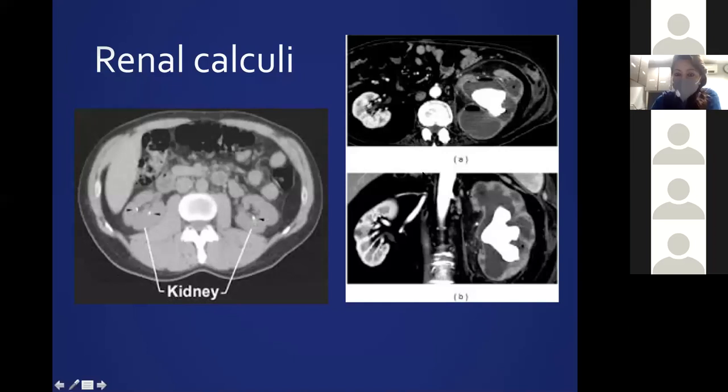This is another case in which the CT scan is showing a large staghorn calculus within the renal pelvis, dilatation of the upper and the lower pole calyces. There is also associated enlargement of the left kidney due to edema and the mass of the dilated calyces.